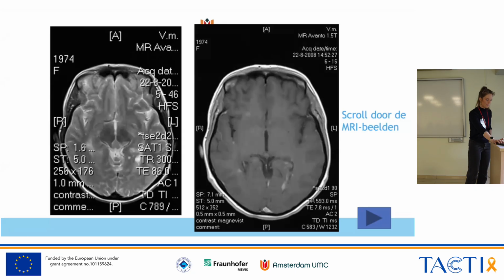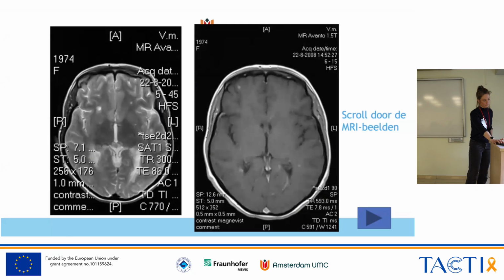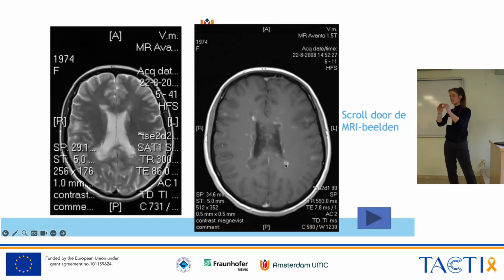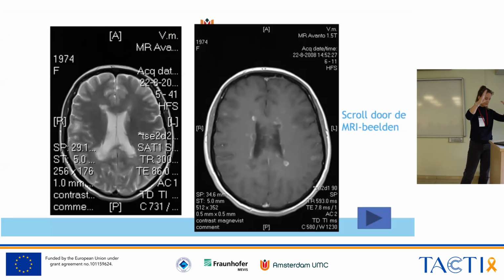You see that punctate lesions and round lesions are next to each other. So you can see the variability of the lesions, and understand why people might mistake this for metastasis. And you mean here you have the enhancement of the border of the lesion? Here you have a ring, but here you have something more punctate. I think it also changes over time. Perhaps they start as one homogeneous blob, and then they grow and it moves to the periphery.